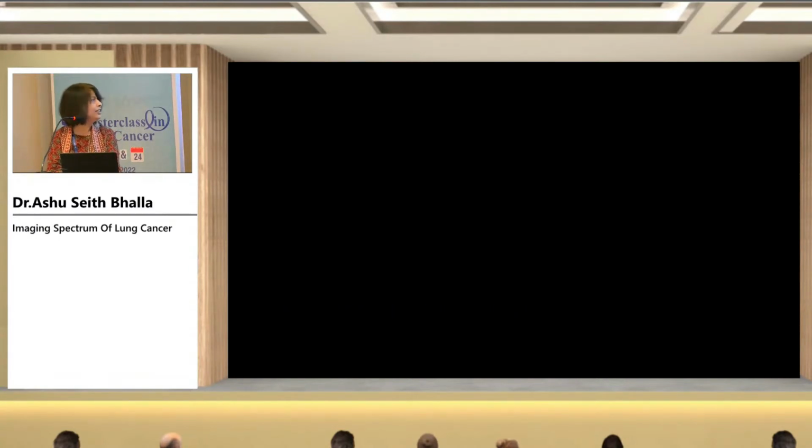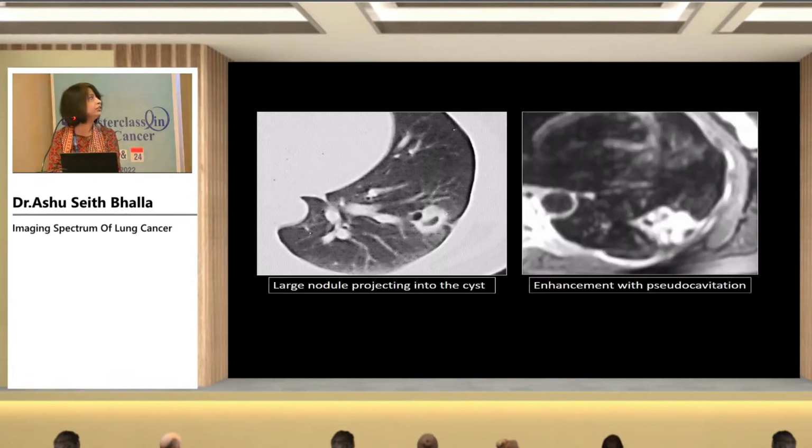So cavities and cysts are one of the commonest reasons for missed lung cancer. Another patient we missed about 15 years back was also being treated as tuberculosis for long. Now we know that these are bubble lucencies. Over a period of time, this cavity wall kept on thickening, and she came with anterior abdominal wall metastasis. She was a scientist with us, 36 years old. So cystic space associated lung cancers are one entity which are missed.